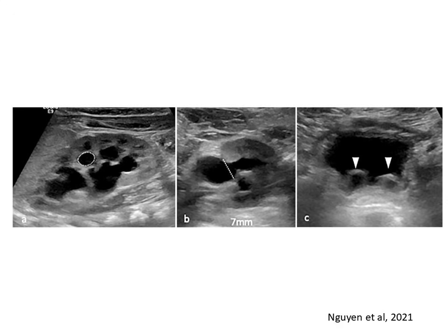Although these two features would indicate UTD-P2, the presence of bilateral ureteroceles, arrowheads in C, in the bladder indicates UTD-P3. A ureterocele is cystic dilation of the intravesical ureter, and although it is a part of the distal ureter, it is considered a bladder abnormality in the UTD classification system because it is seen when visualizing the bladder. The ureters were dilated, not shown.